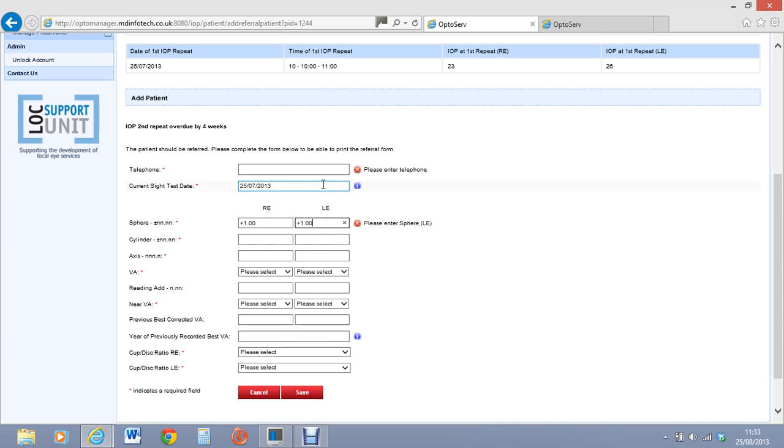Sorry, I'm on the laptop and it's a pain putting in numbers. Again, I tend to get the staff to put these in for me, and I just sign off at the end.